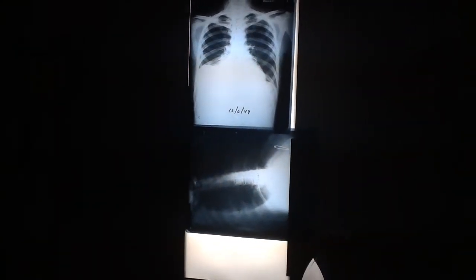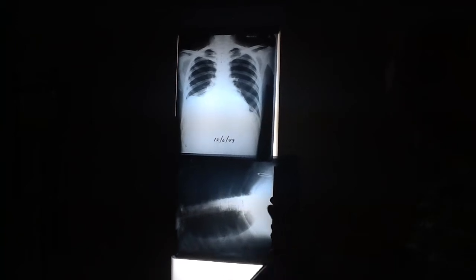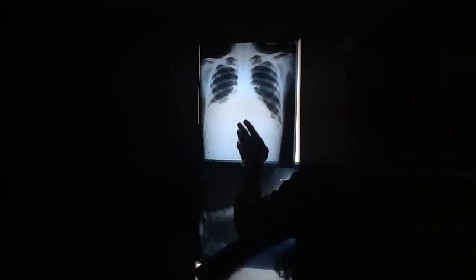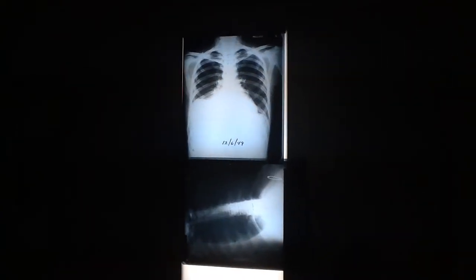So there's the decubitus. Remember, a decubitus is a frontal view, patient lying on their side. So it's just this view essentially, we just lay them down on their side. That'd be a right lateral, left lateral. Horizontal beam frontal, patient in a decubitus position.